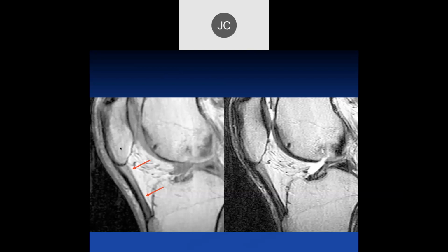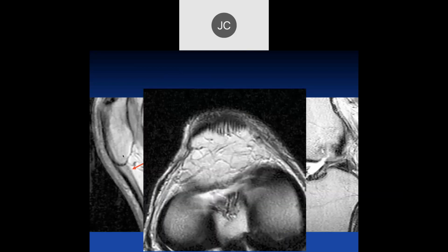I think these large inferior poles of the patella significantly predispose to patellar tendinosis because of the stretching of the tendon due to this abnormally rigid lever arm. Flexion becomes a real problem in this condition, past 90 degrees. Okay. All right, Greg?